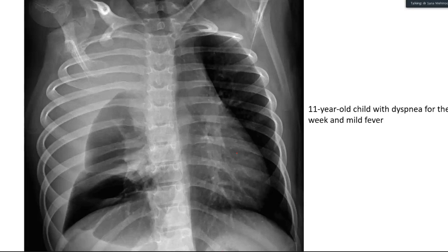So there might be a chest lesion which, because of the diffuse opacity, I might be missing on the frontal view. So I would like to go for a lateral, and then I would go for CT examination. All right. We will only decide about CT scan if we have a logical reason to do it. Now let's start and pick up the various abnormalities that you see on this chest radiograph.